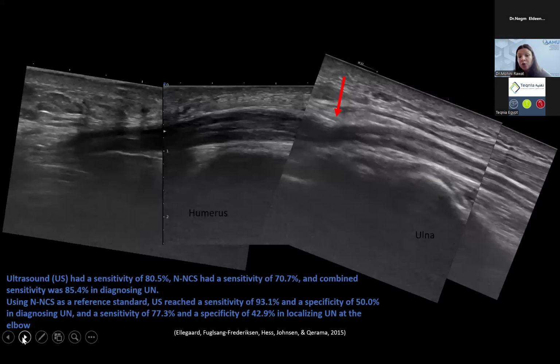This is a panoramic view of another case, more significant, more compression. And as you can see, there's a constriction site here. You can see normal texture distal to that site, and there is swelling proximal to that site. So there is almost like this engorgement. If you remember that pathophysiological process of endoneurial edema, how that happens because there's compression, which leads to change in permeability of vessels, which again leads to more accumulation of fluid in that area, and it goes into this vicious cycle.